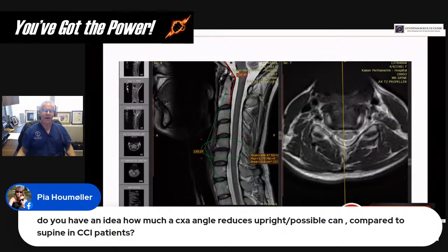Okay, so what we're talking about here, which is pretty critical to understand because I think a lot of neurosurgeons don't understand this, is that in this particular patient, I've drawn this angle to roughly approximate where this person's neck curve should be. So that's a normal lordosis, or neck curve. You can see that her actual neck goes backwards here, centered at C5-6. It should be a shallow curve going out this way, but instead it's going backwards, centered at this level.